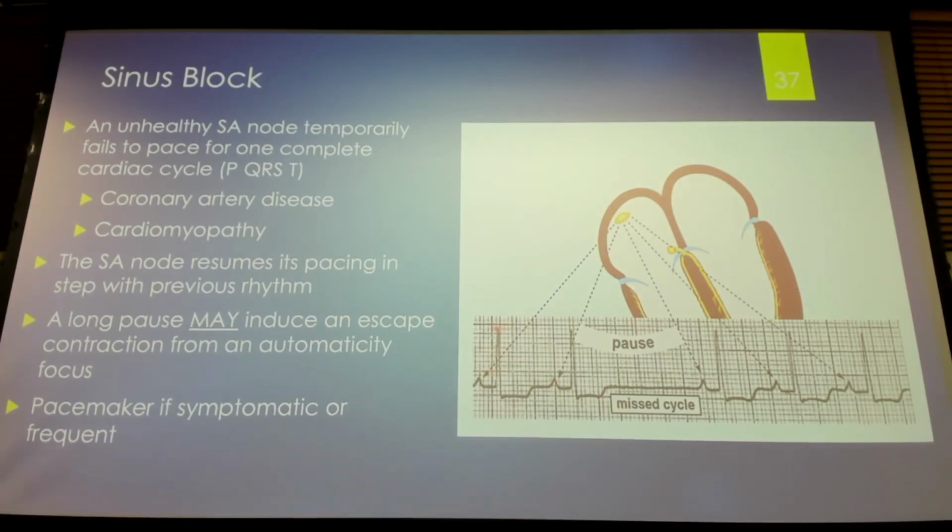So if you were to measure from R to R, we should have an R wave about here, but it's missing, so that whole cycle is missing, and then we go to the next. If you're thinking, well, I only have 2 here, you come back here, take that piece of paper where you put your little tick marks, and move it over here. You can see, oh wait, I'm supposed to have a QRS complex here. I don't have one, but this lines up and this lines up.